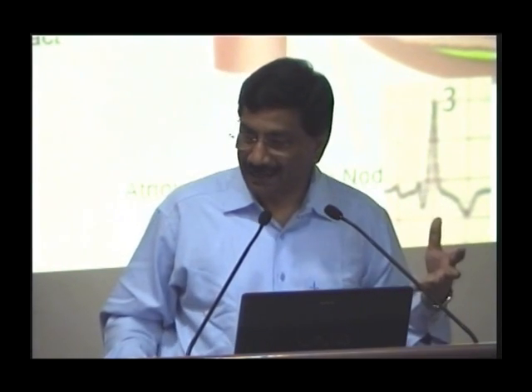That means I have a terminal R wave in V1. But this terminal R wave comes slowly, it gets widened. So I get a terminal delayed slurred positivity in V1. It is a right bundle branch block. Because this vector is coming towards the right, my left sided leads will have a terminal delayed slurred negativity in V5, V6. So this is a right bundle branch block.